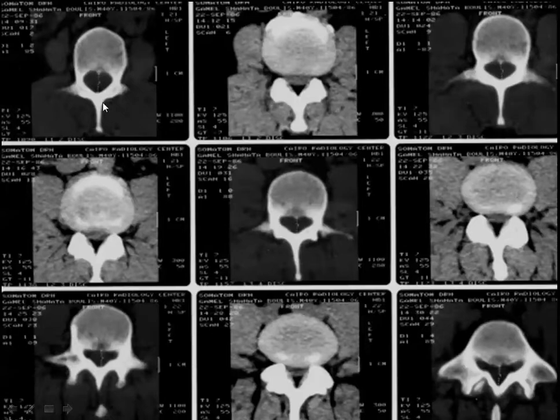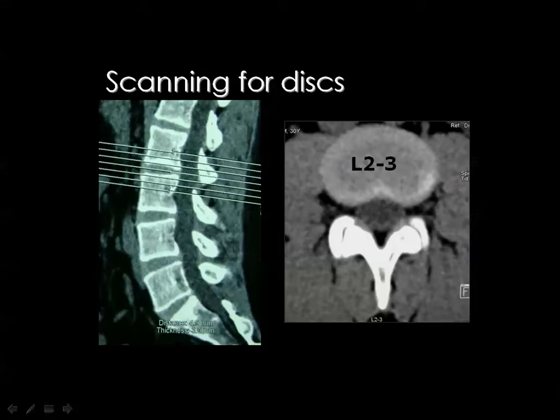If you measure the diameter of the lumbar spinal canal and you see the distance here is 1.2, you know that this canal is relatively narrowed, while here 1.1 is also relatively narrowed, and here 1.0 is also narrowed, and 1.1 is also narrowed, 1.4 is normal. So you know that the diameter of the spinal canal may be normal at some levels and narrowed at other levels, and you should mention this in the report.